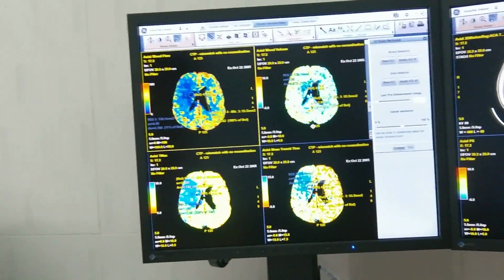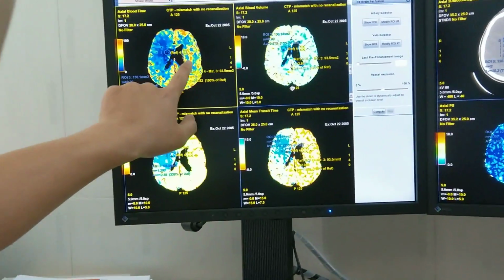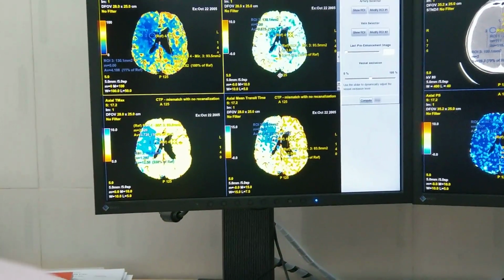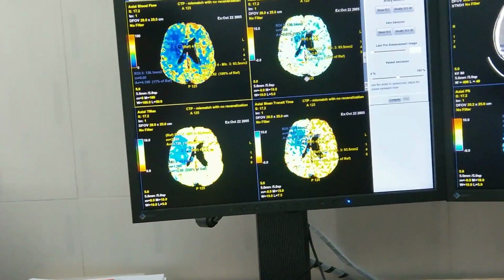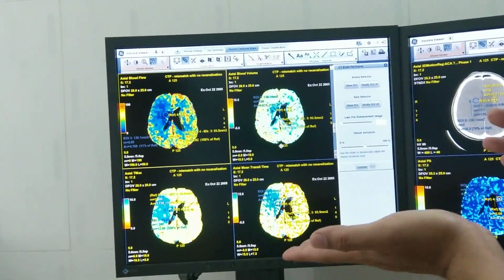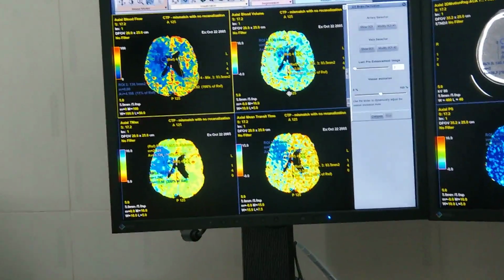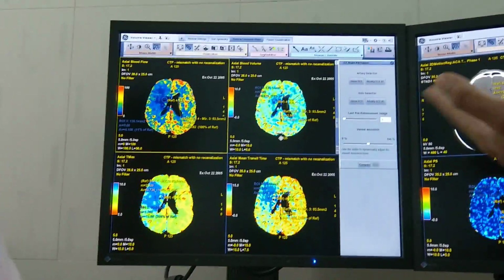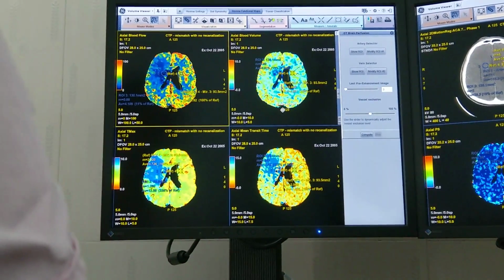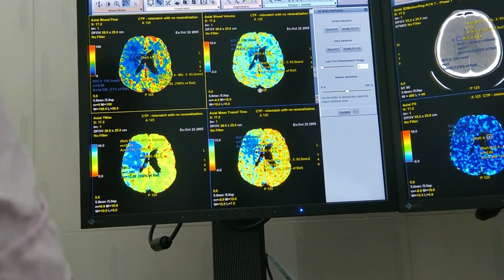Cái percent này, mình lấy vùng bên này làm chuẩn, coi như là một mô não normal tissue. It depends on the research paper. Some say 60% less, some say 50, some say 40. So you have to read and you have to follow which guideline you want to use. Nói chung là cái gì cũng rất nhiều guideline, nhưng thường thường nó là khoảng 50-60%. Thì nếu nó sẽ chênh lệch về phần CBV.